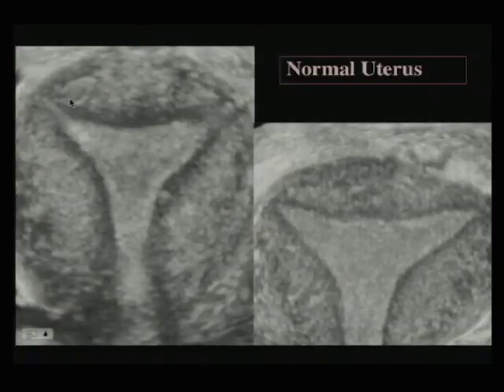But it is amazing how sometimes the actual display can differ from what you think in your mind's eye it should be. Also, 3D volume imaging makes us much less dependent on the person who's actually scanning, because you're not just dependent on the one picture that person took; you can rescan the volume and generate any pictures after the patient is gone.